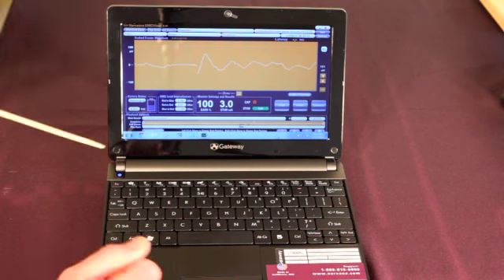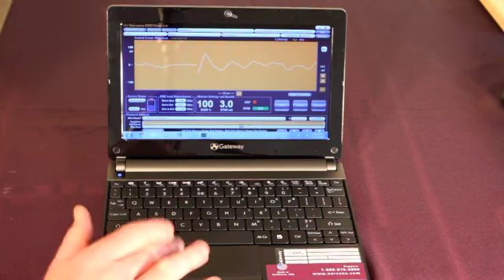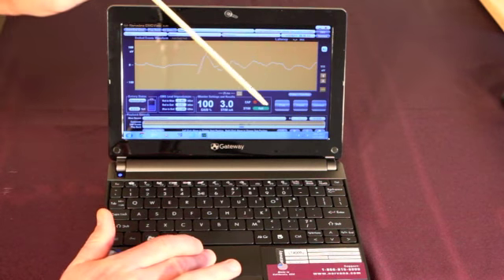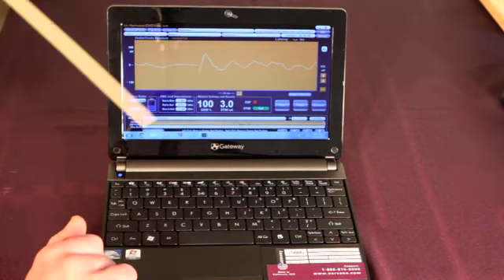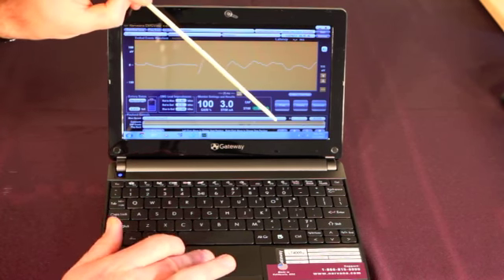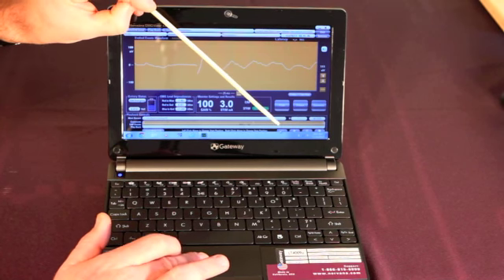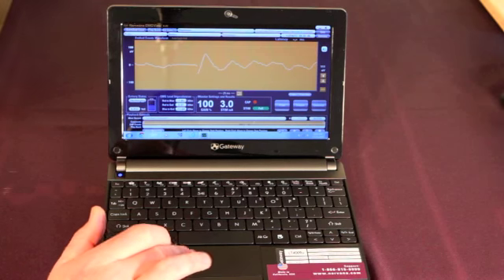The last thing I want to show you is how to reset the start and stop points. Let's say now that I would like to go back and review something from the beginning of the case. The way I'm going to do that is I'm going to click stop. You'll notice that when I do that, the blue bar disappears. That allows me to reset my start and stop points. I'm going to go to this first control button over here in the playback controls. It's an arrow in the shape of a circle.